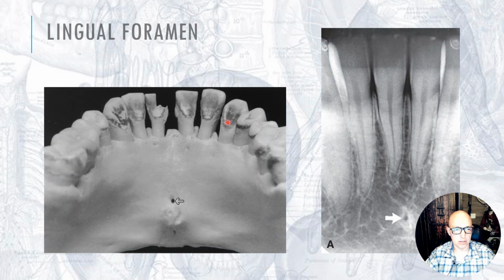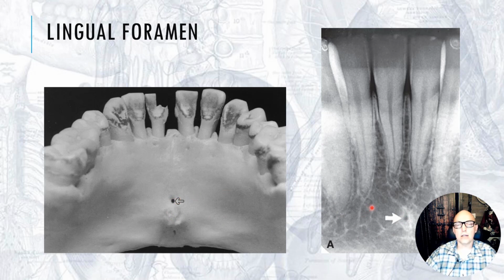And as promised, if you have this small round dot radiolucency, usually right in the center, there is some variation of this. Sometimes you'll see several lingual foramina. A lot of times you see the genial tubercle pull kind of around the foramen. In this case, it's more inferior. But if I specifically say, okay, what is this round radiolucent dot, then you know it's the lingual foramen.